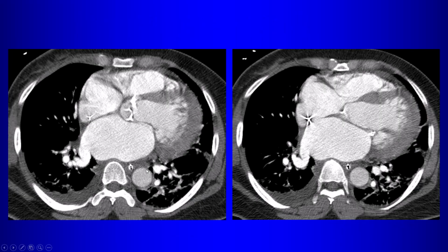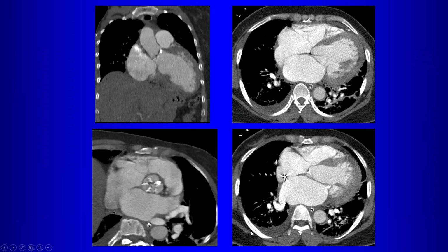This patient has calcification here of both the aortic valve and the mitral valve. The left atrium and the left ventricle are dilated. So this was a patient with rheumatic heart disease who had mitral stenosis and aortic valvular stenosis. When the aortic valve is involved in patients with rheumatic heart disease, most of those patients also have involvement of the mitral valve. And then some more reformatted views in that same patient showing you the calcification of the aortic valve. This patient did have aortic valvular stenosis confirmed on echocardiography. And then here is our calcification of the mitral valve.